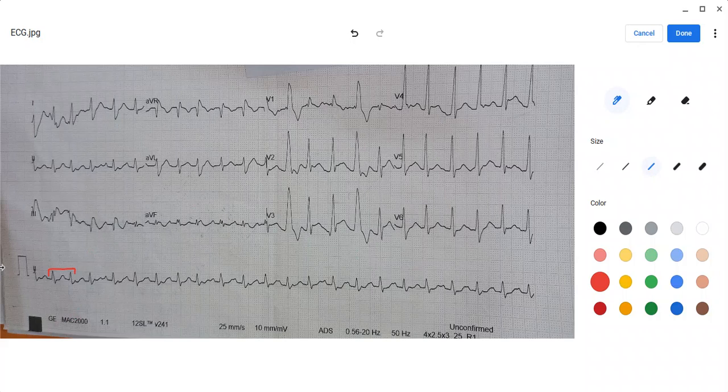So when the sympathetic system is activated, sometimes ventricular premature contractions are also visible. If you look in the anterior leads, these are very clearly visible. This is the classical phase of ventricular premature contraction. They always look like this. If you're able to memorize this picture, you will always be able to find ventricular premature contraction. It always looks like this.